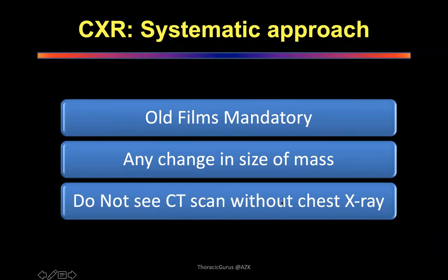Another golden rule of radiology is please don't just jump to the scan and keep scrolling up and down all the time. If I was you, I would say, can I see the chest X-ray first, please? And the examiner may tell you, no, go ahead with CT. That's fine. But most of the examiners will appreciate it if you ask for a chest X-ray, because most of us actually grew up in an era of chest X-rays.